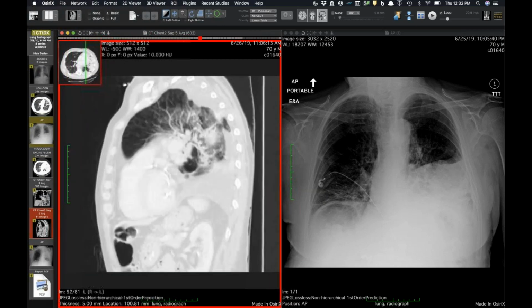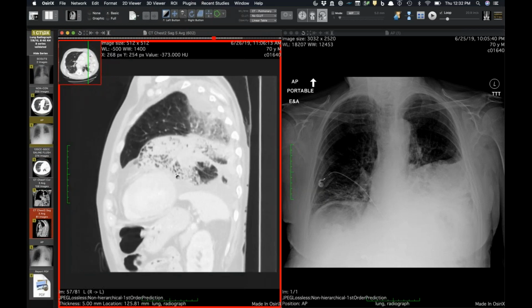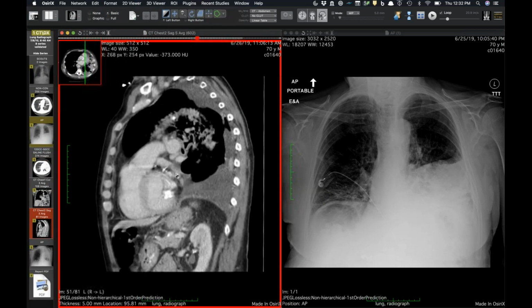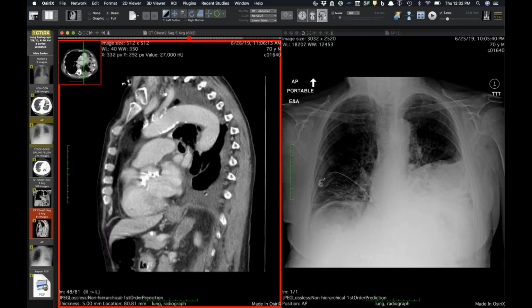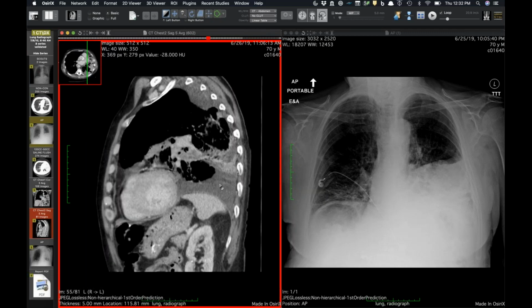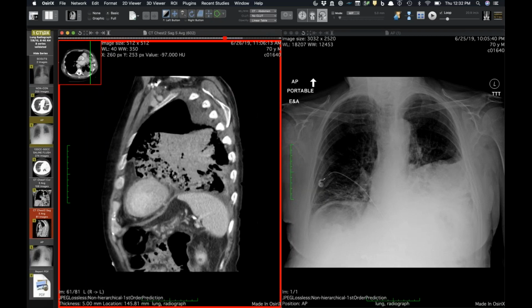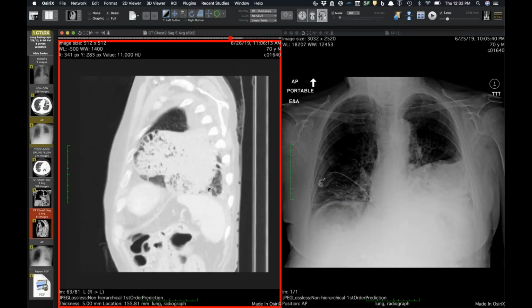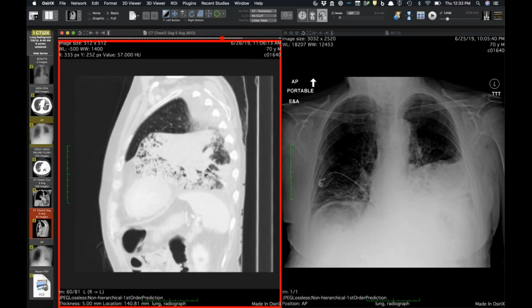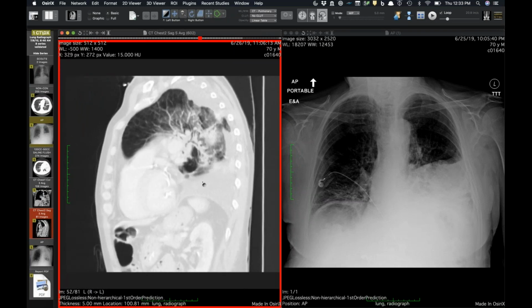So that left lower lobe, the left upper lobe is socked in. So it still looks like pneumonia. Certainly pneumonia can hang around for a month. And I talked to the surgeon. So he actually did this thoracoscopically, where he went in and detorsed the lung and then plicated it. And the surprise was he took a little snippet of lung for the plication, and the path a few days later came back as adenocarcinoma.